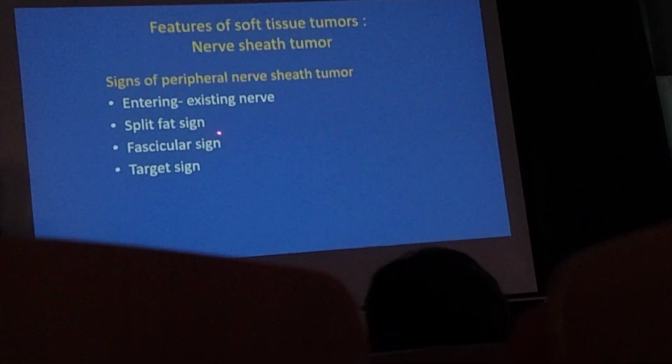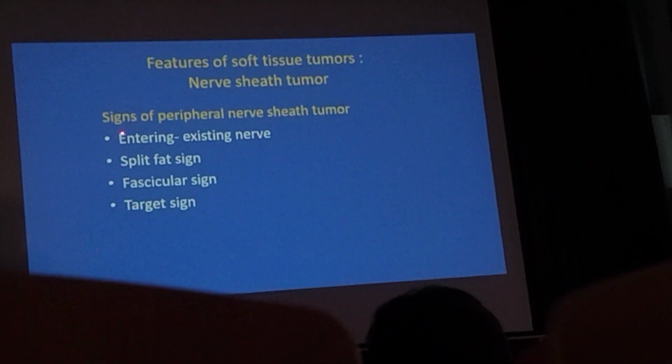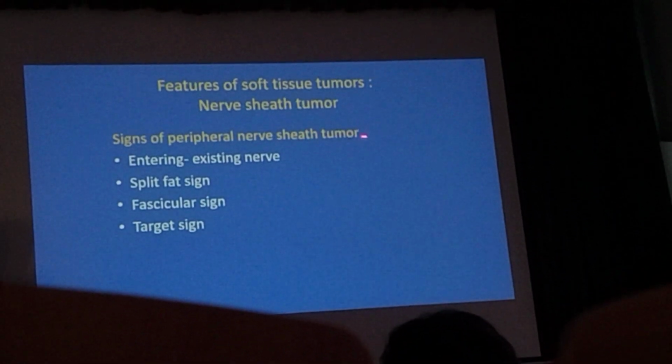Okay. And there's a size that I will show you one by one. This represents the peripheral nerve sheath tumor.